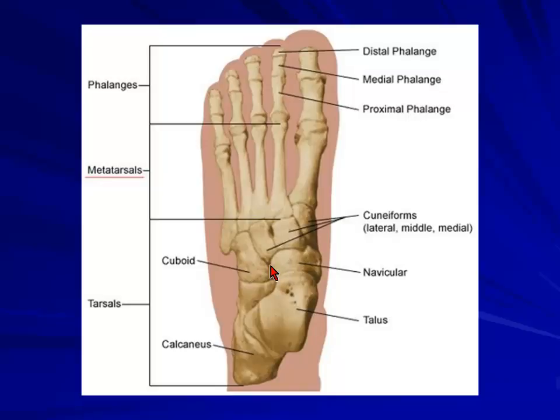This is very important. When you're looking at the SPECT CT and you see uptake, you need to define the anatomy, whether it's degenerative or whether there is pseudoarthrosis, because most of the patients will have had fixation of the joints, either with screws or nails or something else, surgery, osteotomies. So you need to describe where the abnormality is, where the abnormal uptake is, and where you see CT changes. So it directs the surgeons where to intervene to relieve the pain.